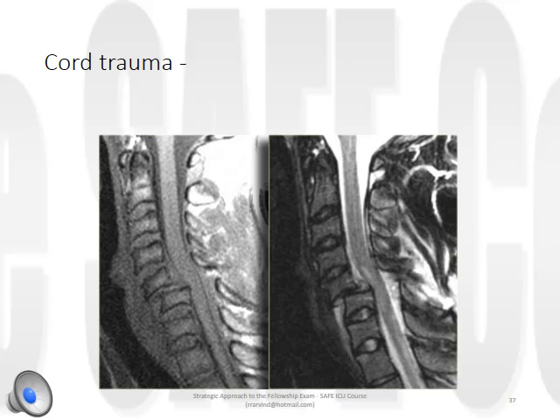Again, there's some edema in front of C6 on the T2 image. And if we look at the T1 image, you can see that there is a significant soft tissue swelling anteriorly. Again, that same rule: the prevertebral soft tissue is more than 1 vertebra width wide at the C5-6 level.